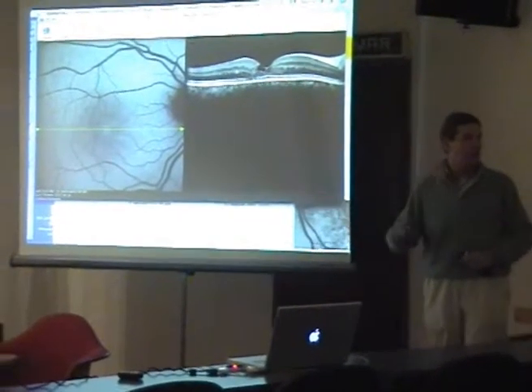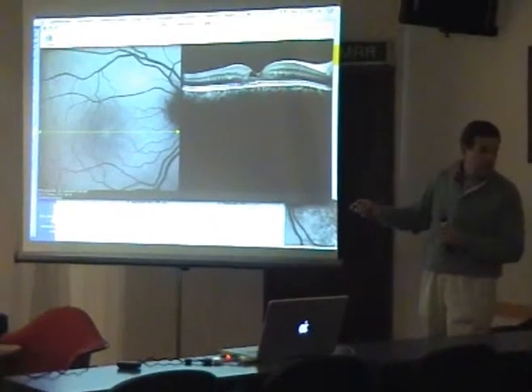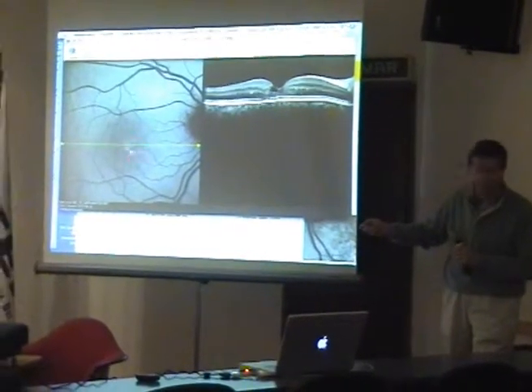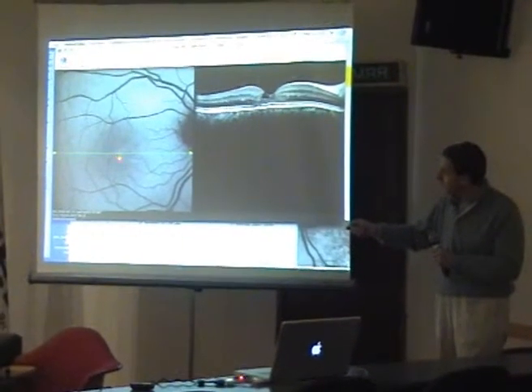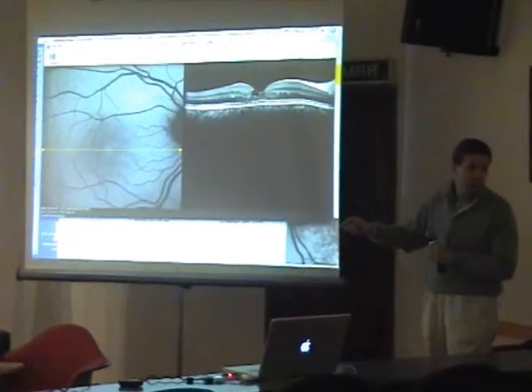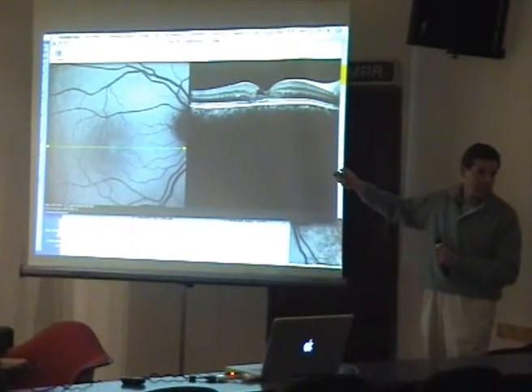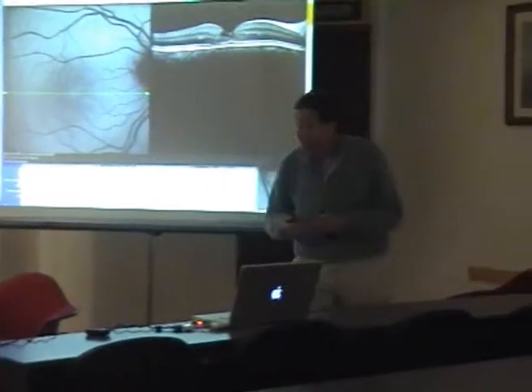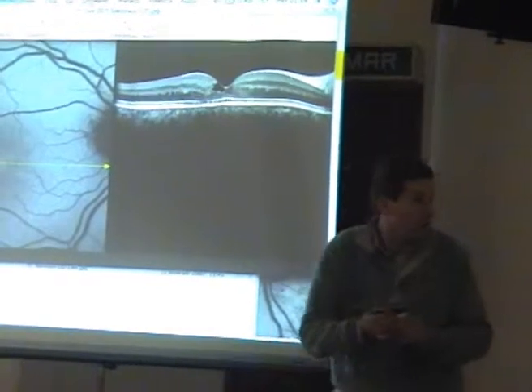Remember in juxtafoveal telangiectasia, the macular pigment was not evident. You see, there is no dark spot in the center, and you see that there is an area with an increased autofluorescence that corresponds to this hole, to this cyst. And if you look at the fluorescein, you know that juxtafoveal telangiectasia has leakage here, or what we call leakage.